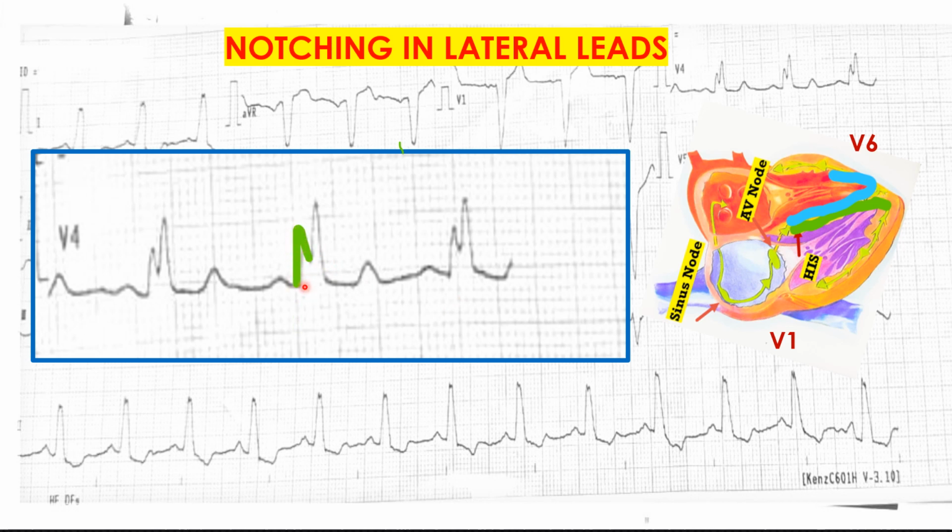So you can see that. The initial pattern from here to here is because of this activity, and the next activation from here to here will be from this blue area. That is the reason the complete activation of the left ventricle is split into two halves because of the delay in the left bundle.